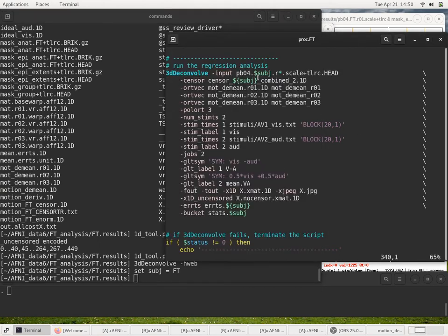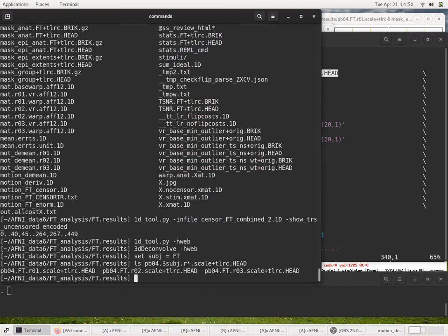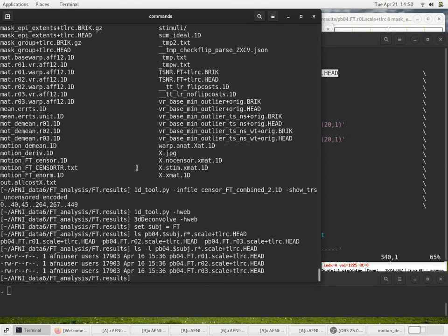So if I set that variable here, and I'll just do ls on this, or how about a long listing, so it looks more like a bunch of files. When we apply this with a wildcard, the shell sees this wildcard and it fits it with anything that it can. In this case, there's a 1, a 2, and a 3, and it finds 3 file names.